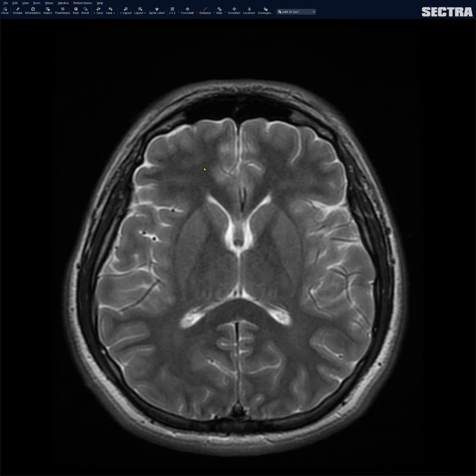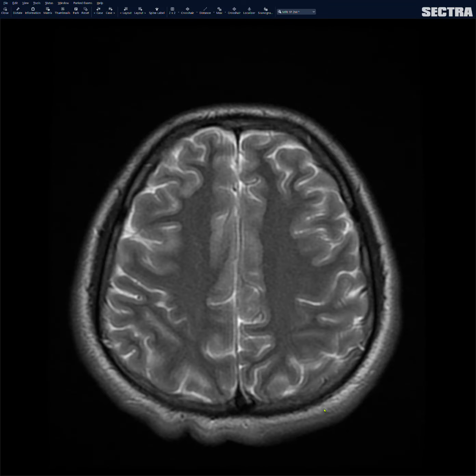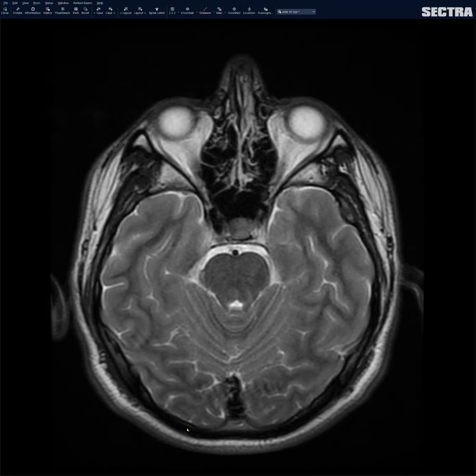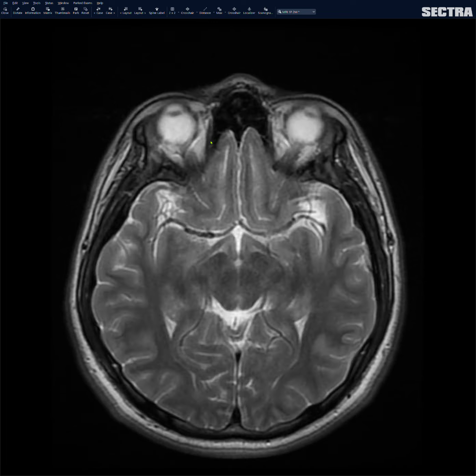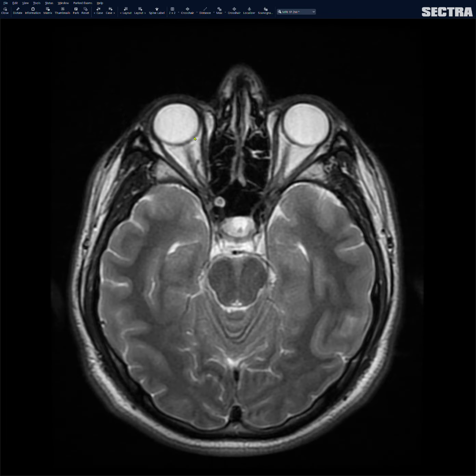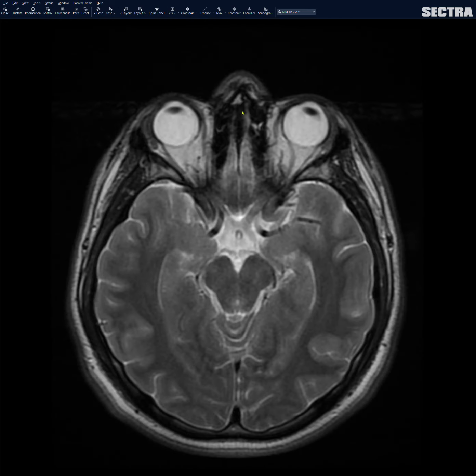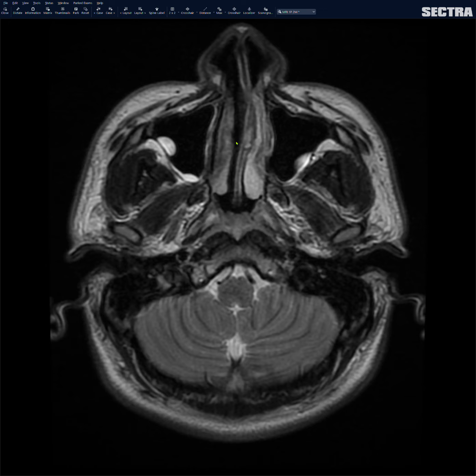I look at the scalp for any kind of soft tissue swelling in the scalp. Okay, I look at the scalp posteriorly, laterally, anteriorly. After that, I look at the orbits. I look at the globes, make sure they're intact. I look at the orbital fat. Great. And then I take a look at the paranasal sinuses. All right, make sure that they're clear.